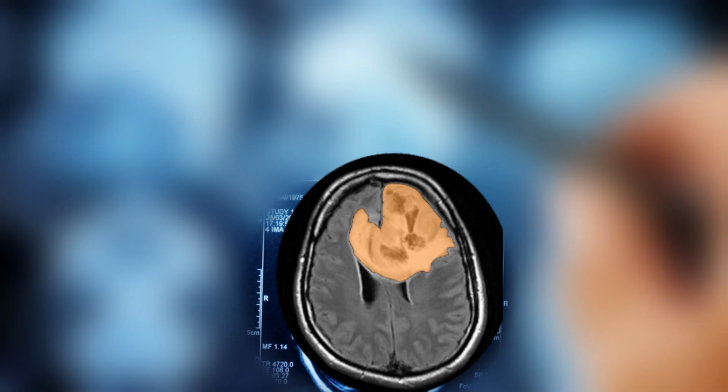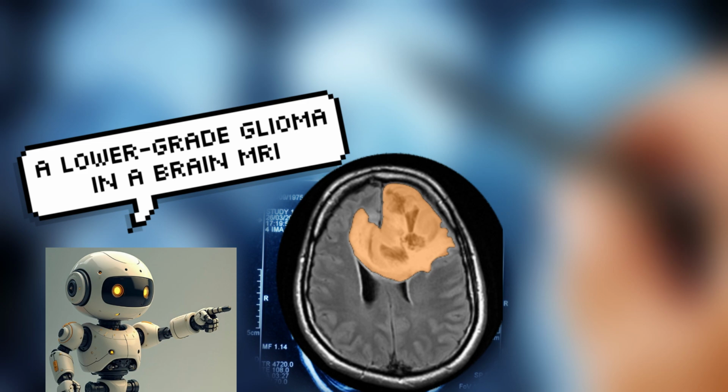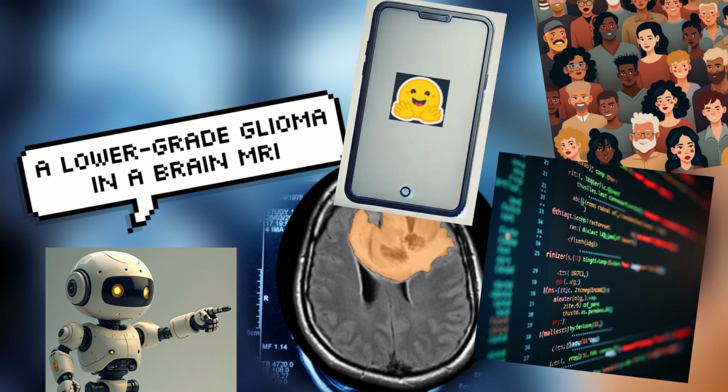Imagine an AI that understands medical images as well as a radiologist. Now imagine anyone can use it, no coding required. It's a revolutionary AI model designed to analyze medical images with incredible precision. But here's the problem. It requires coding skills to use. So, I built an app anyone can use.